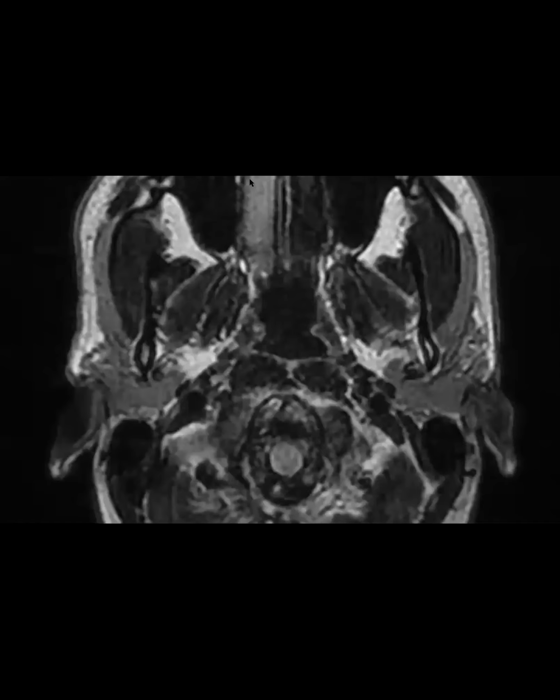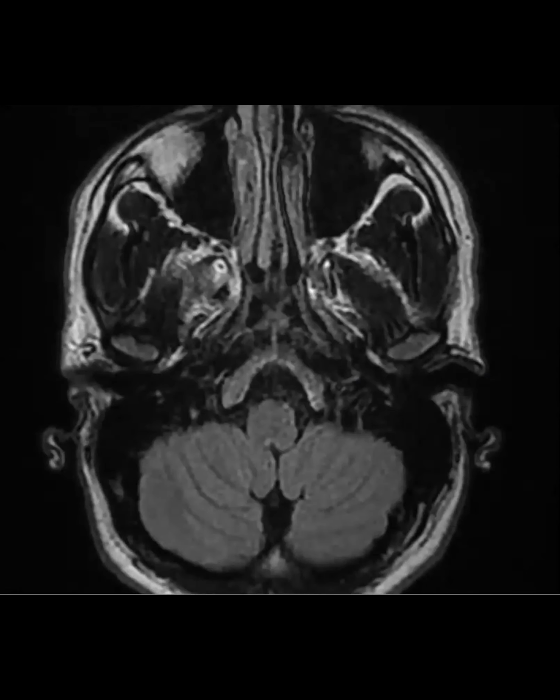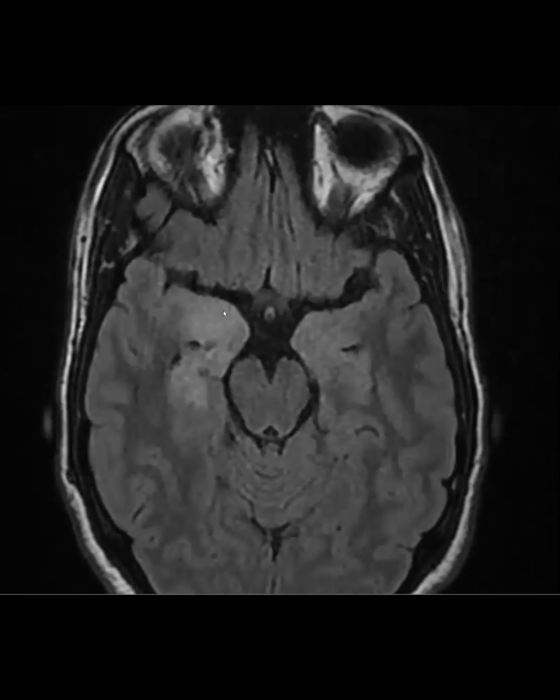Okay, great. All right, I know I'm showing a brain, but there's a reason for it. So this is a 26-year-old guy with no prior medical history who basically showed up to the ER with acute onset anterograde amnesia. So he could remember everything that happened before a certain date, but nothing that happened after. So we start off with a brain MRI, and what you can see is that he's got these areas of T2 FLAIR signal in the medial temporal lobes.